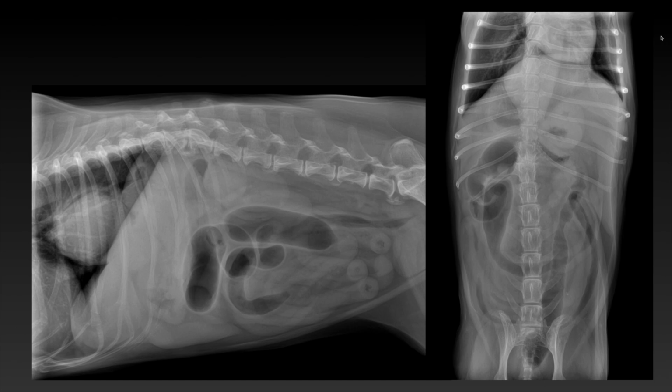The intervertebral disc spaces T12-13 and T13-L1 are narrowed and ventral spondylosis is present. Spondylosis is also present to a lesser degree in the lumbar spine and at the lumbosacral transition. L1 has one broad rib on the right side.